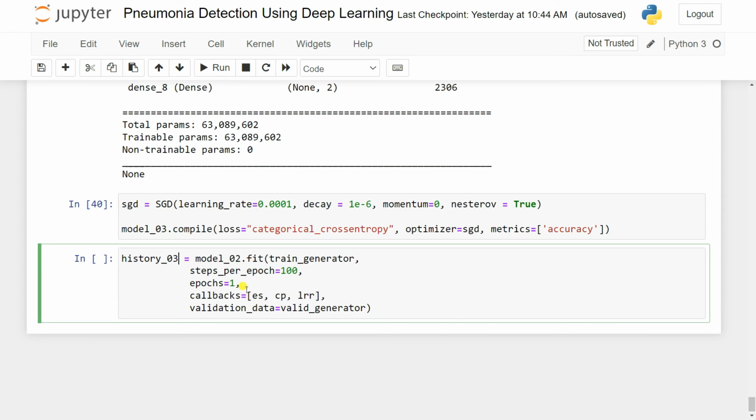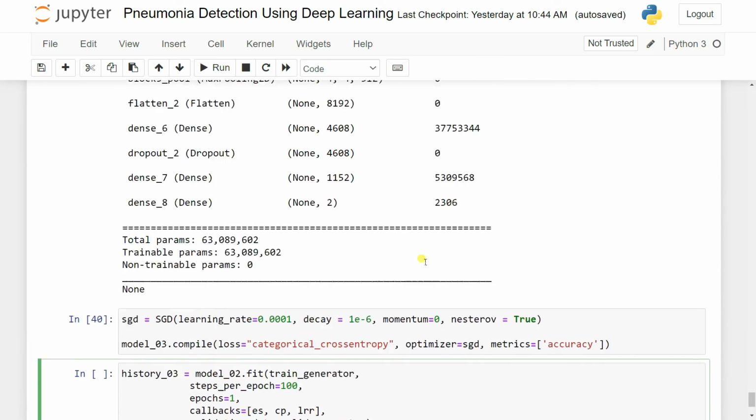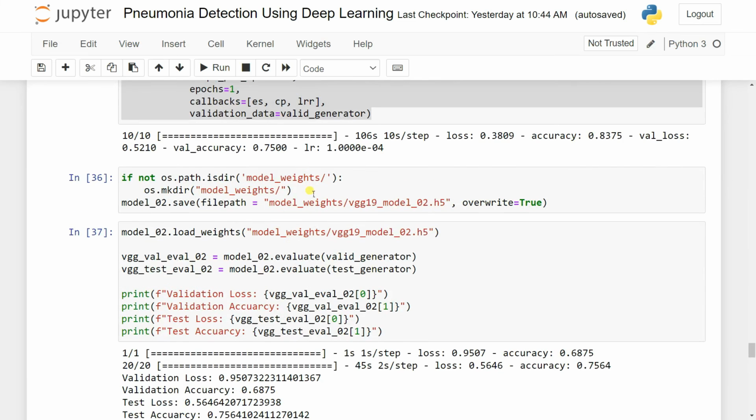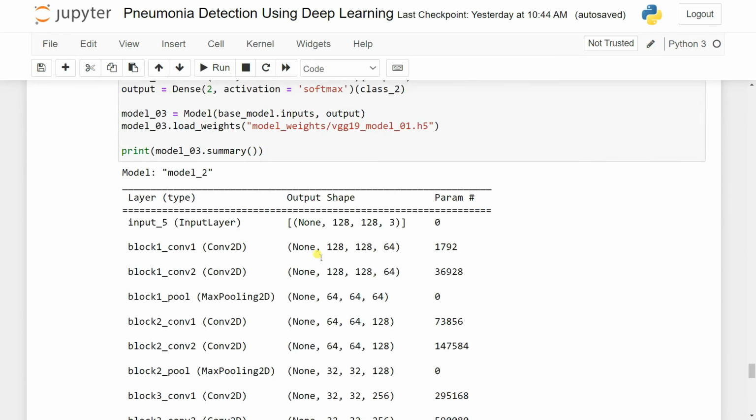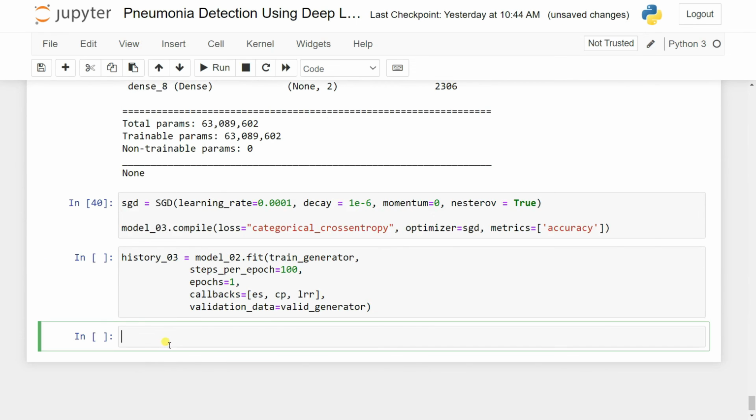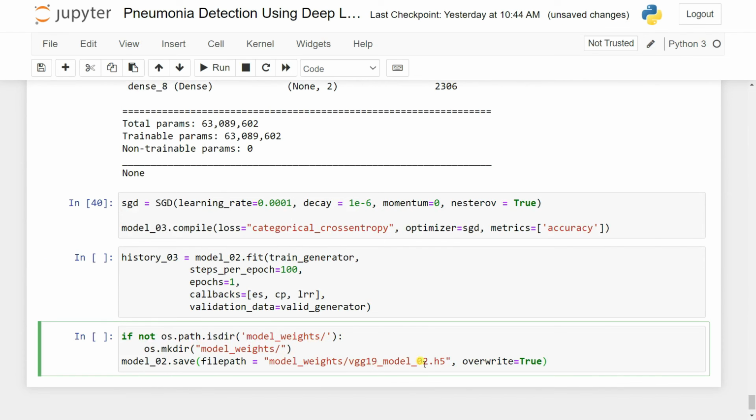the files. Otherwise, you can also download the pretrained model file that I actually made earlier. You can also use this one. So this is how you can use here the history number 3 and save it inside your directory. So how can you save this one? You can use this command, the same thing. The code is almost the same. You can simply use it here like this way. Just need to change here 032 to 03.